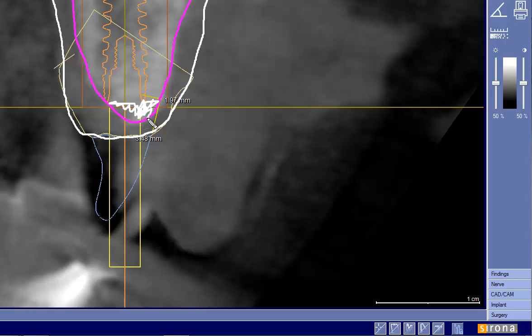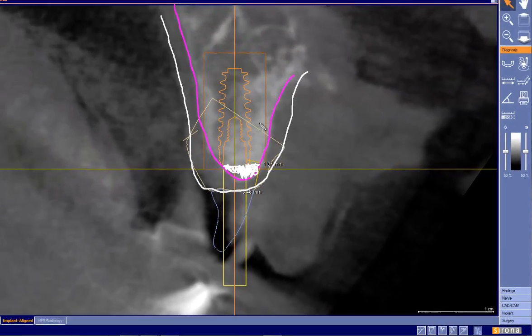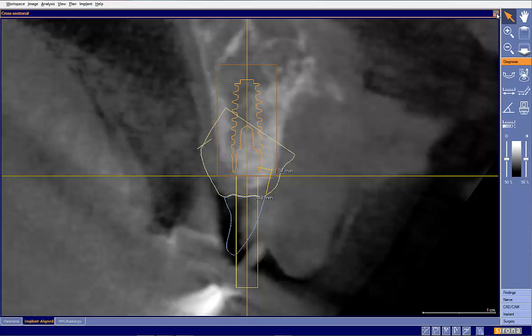is extraneous bone. Now the good news is when you do your osteotomy, all of this bone right here is going to be lost, and I personally wouldn't mess with this bone right here. I think we'll be able to build it out, we'll preserve it. I don't want to remove it. I believe it'll go away on its own. So just kind of be aware mentally of what we're looking at here.